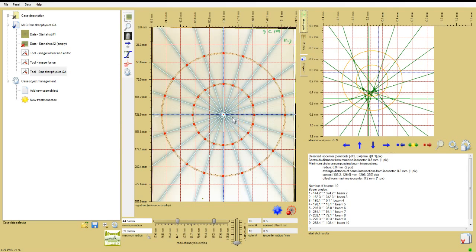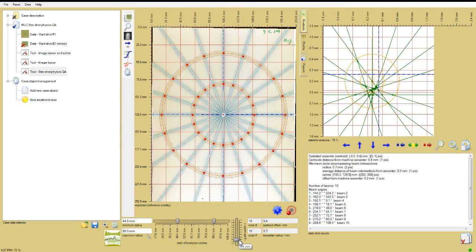Path width of about 3.5 to 7 millimeters is ideal. That's approximately 10 to 20 pixels at scan resolution of 72 dpi. Adjust the path width with the vertical slider at the bottom of the image window. As the path width is adjusted, the value is displayed in the slider button.